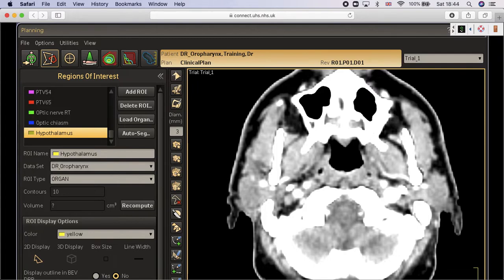So if you can spare the pharyngeal muscles, this may help patients reduce the problems from any kind of swallowing problems in the future, less aspiration.